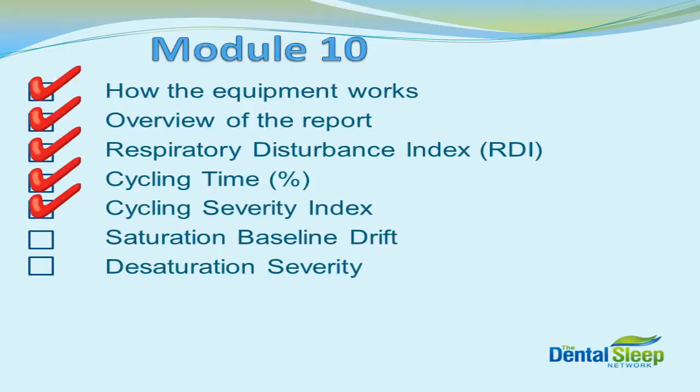The next two graphs are used to help you determine if there are potentially other problems with the patient, not necessarily related to sleep apnea.